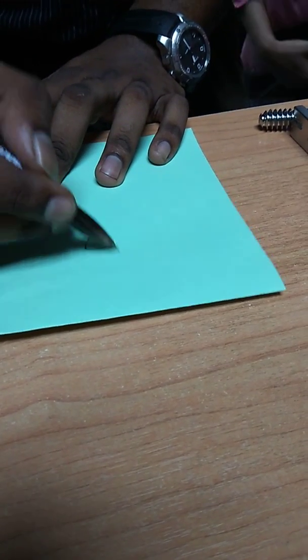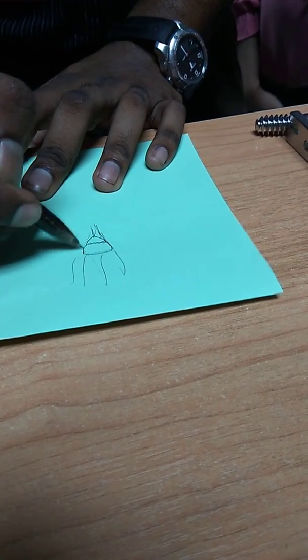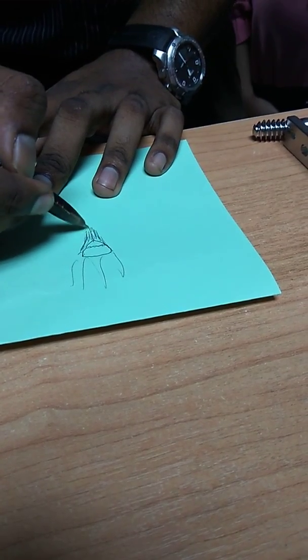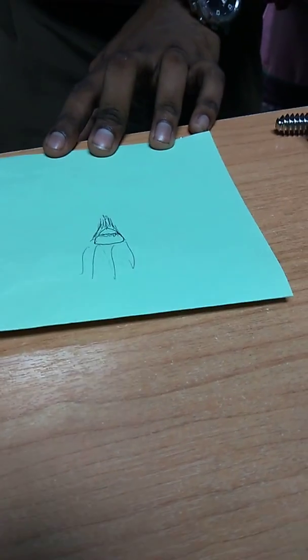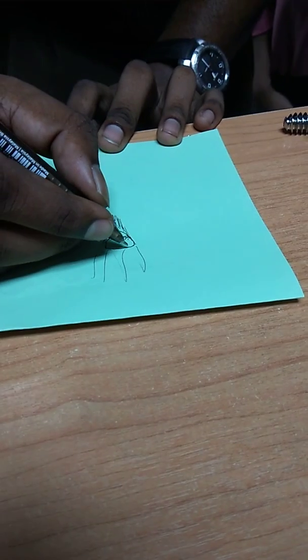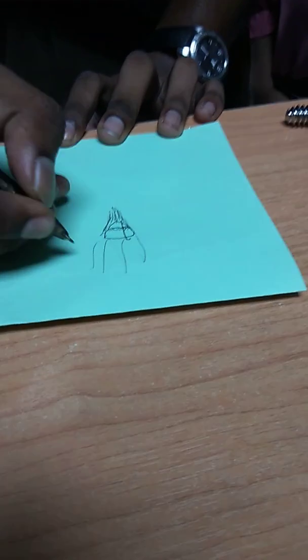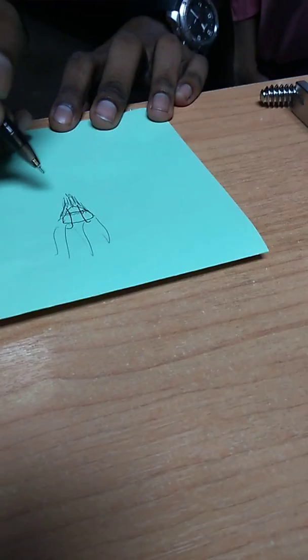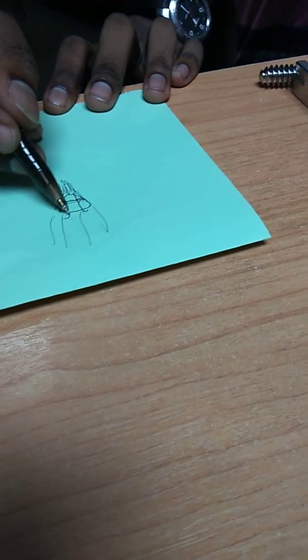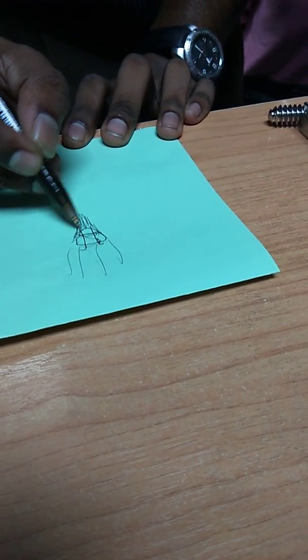Okay, for example, this is the patella. It's fractured in a transverse fracture. Okay, simple transverse fracture. So we drill 2 K wires, one from the top here to down, another K wire from here to here, and then outside of the K wire we put a cerclage wire in a figure of 8 shape.